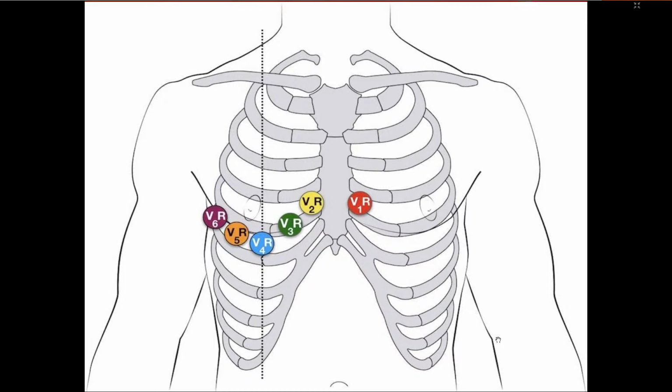Now there is a posterior wall MI. Whenever you have a patient with an inferior wall MI, you have to look for right ventricular infarction. So you can record the leads on the right side of the chest. Normally we record the leads on the left side of the chest, but the RV changes will be visible in V3R, V4R. Similarly, you can record V1R, V2R, V3R, V4R.